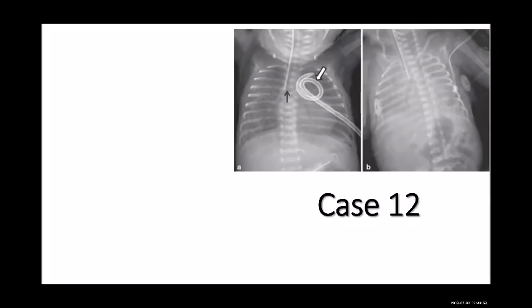We will go like A, B, C, D, right? Airway. Whatever you do, just don't forget. You can go from inside to outside, or from outside to inside. You can start by system. So you'd say, I will comment on the airways. Go ahead. Airway, I see there is an ETT tube. The position, it is above the carina. Above the carina, okay.